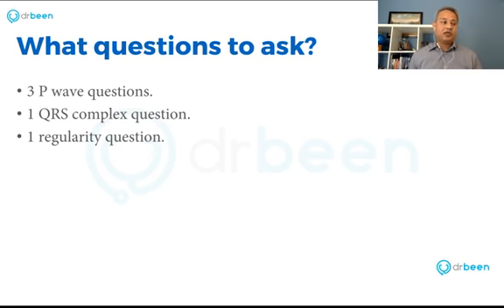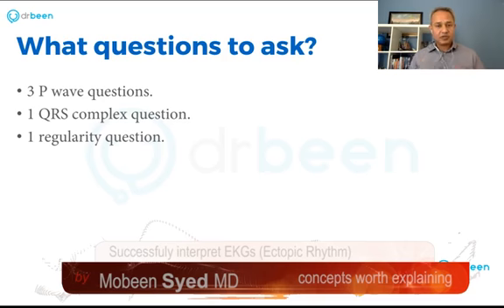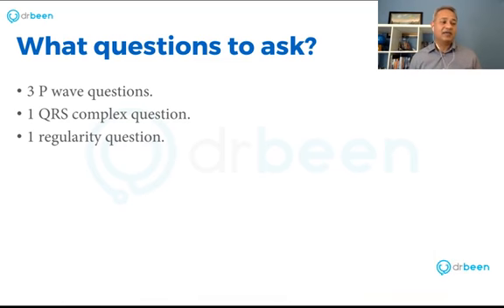Now, what questions to ask when you are working with the arrhythmias? What are the questions that you should ask when you're looking at an EKG? What are the things that you should see? We need to become masters of the EKG, right? So let's see, how do we understand?